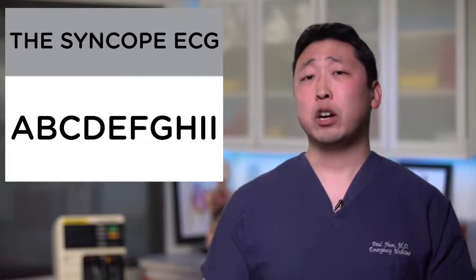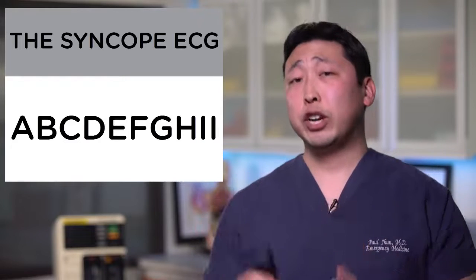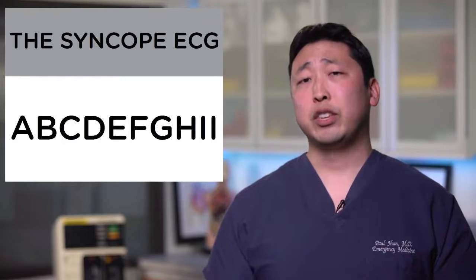F is for fluid-filled heart, pericardial tamponade. You're looking for the electrical alternans and diffuse low voltage throughout the ECG.